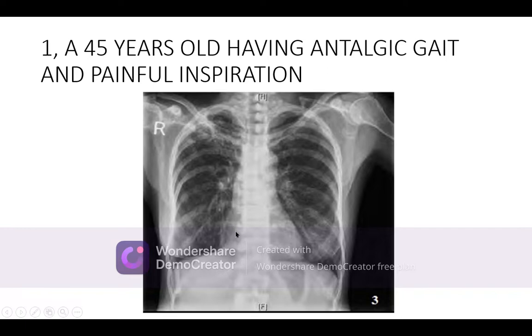And then this is the spine, which is visible, rather more visible, although it is the PA view. And these are the anterior projections which are not seen very clearly, although some of them are visible. For example, here 1, 2, 3, 4. This is the 5th, and this is 6 and this is 7.